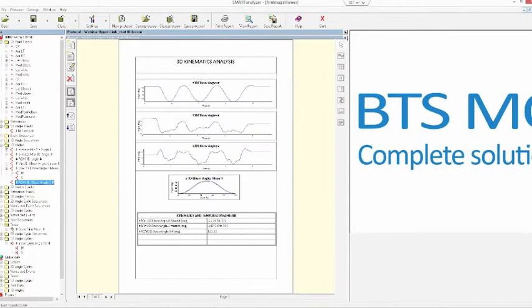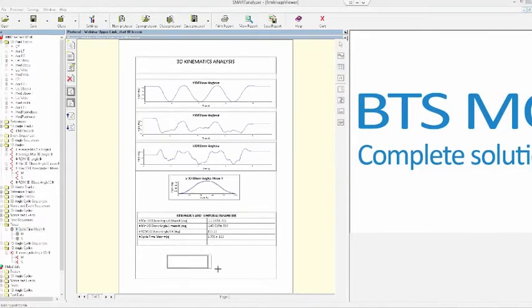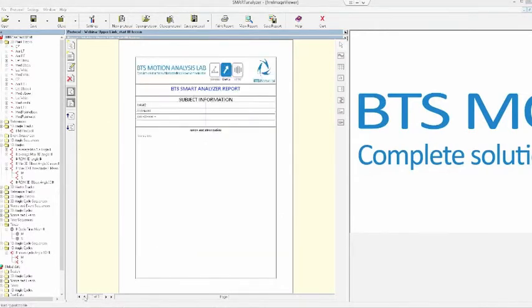Now I also want to add the cycle time. Okay, and that's it. Also in this case, imagine that we want to have a legend, for example, below the pages. Okay, so now we have created 3 pages.